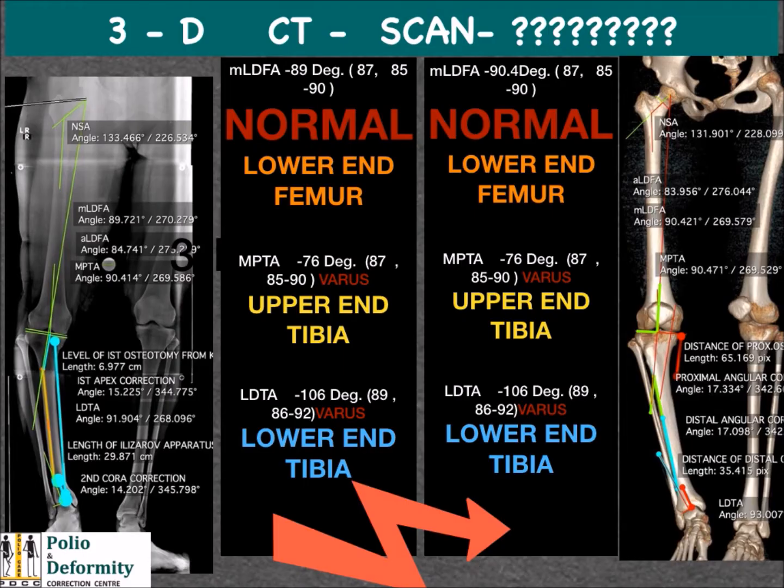And to confirm that, we did a 3D CT scan and we found here also that the neck shaft angle was 131, which was normal.